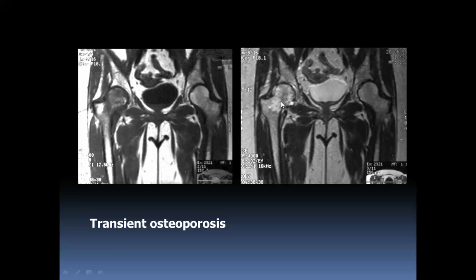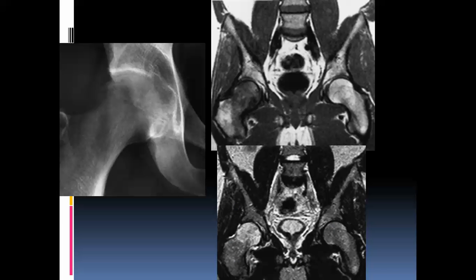And then spontaneously it recovers. Here you find definite change in T1 and T2, edema of the bone, and here is the heterogeneity and osteoporosis.